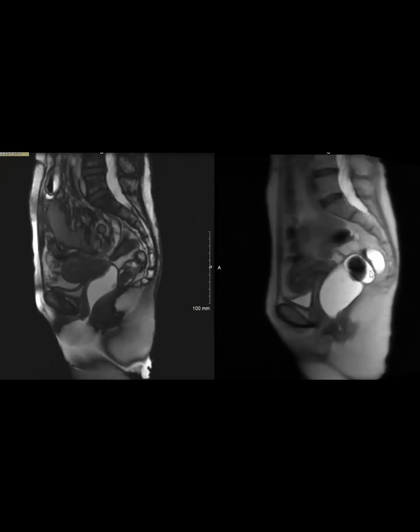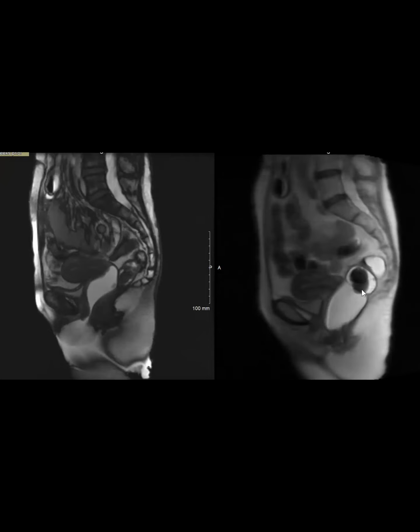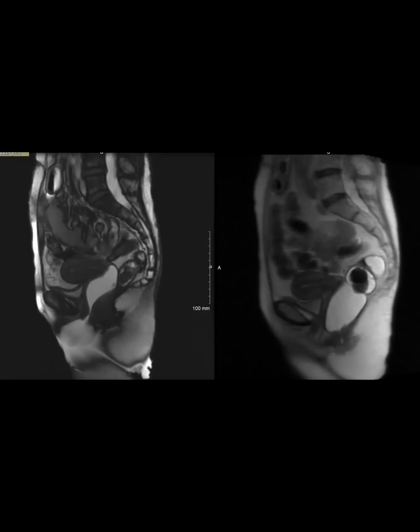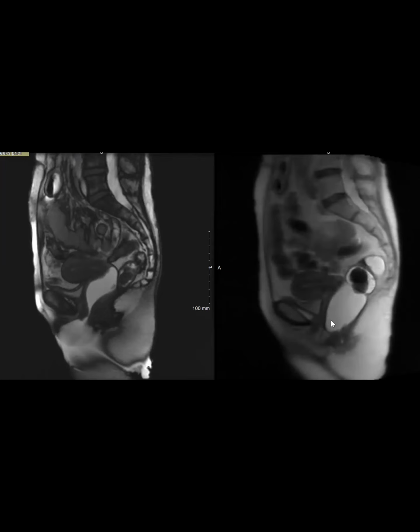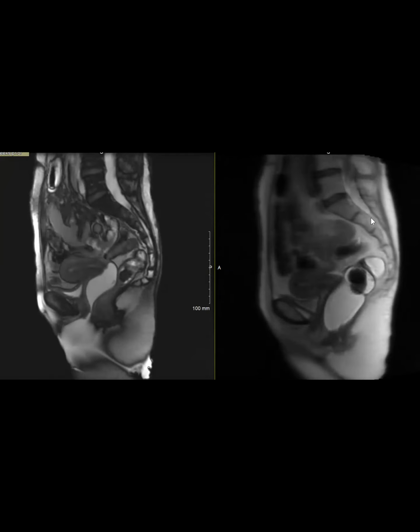good for the patient, but unfortunately for us, she doesn't have any major mucosal abnormalities or intussusception or anything. But you can see how without rectal gel, the rectum is collapsed. First of all, it's more difficult for the patient to do the adequate Valsalva maneuver as opposed to when you have your rectum distended. And you can see that if she was doing any intussusception, you would see it here with the expanded rectum, and there's no way you can see it here. It's just a cute example of why we put gel into patients' rectum for these cases.